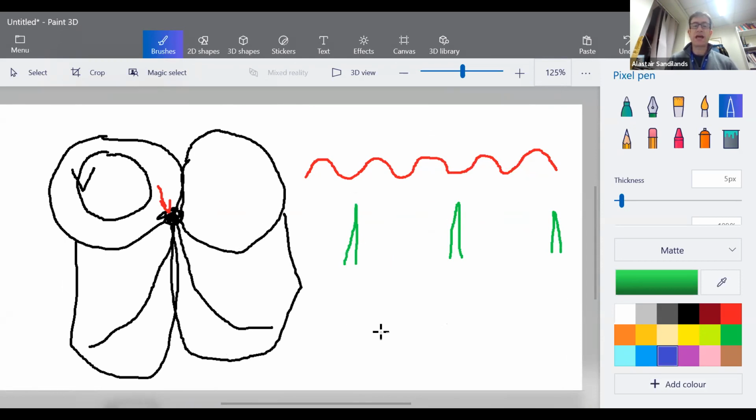So if we put this all together, we have the QRS now here, and the T wave. Put the T wave on top, another QRS here, the T wave, another QRS here. So you have to imagine that the flutter wave is traveling through continuously. The best lead to look at this is in the inferior leads. Okay, so that's a continuous flutter wave.